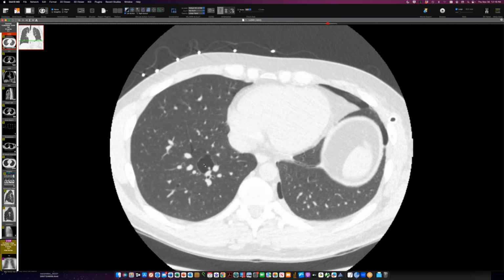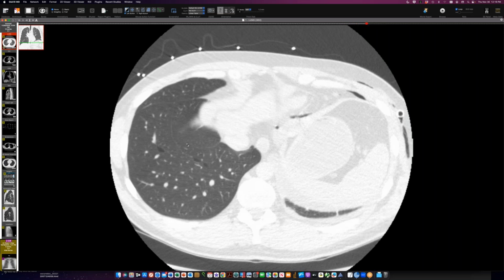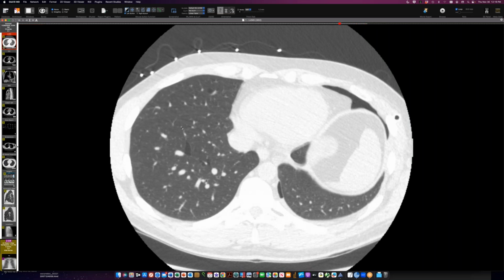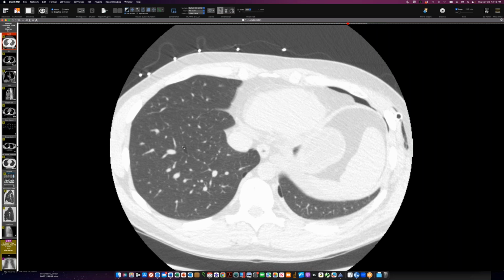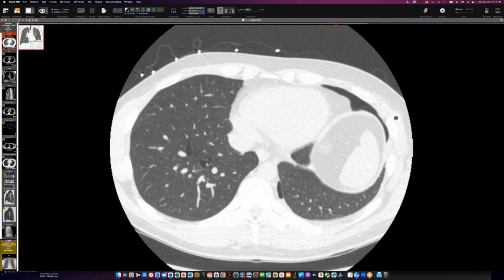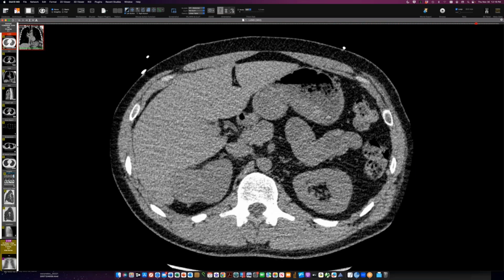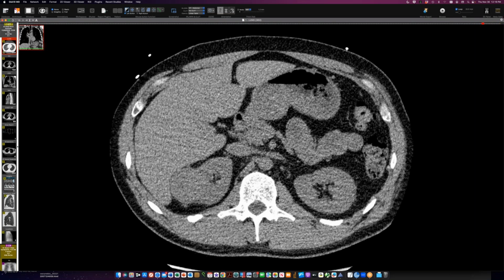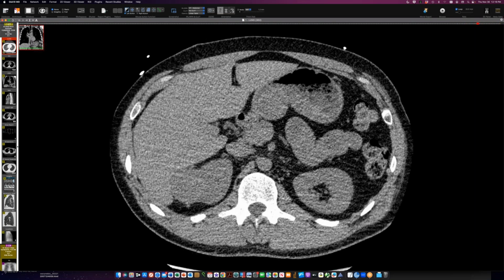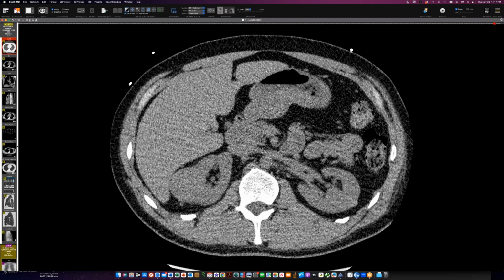There are a few of them, and they have sort of strange shapes, including this lenticular shape here, and hugging a cleft in the lung here. So they like to be up against septa and veins and things like that. And if we go on down into the abdomen, we find that there is a right kidney tumor, which on some enhanced CT scans lit up. So this is very bright here, consistent with a renal cell cancer. It's not been biopsied as far as I know, but there is a right kidney tumor.